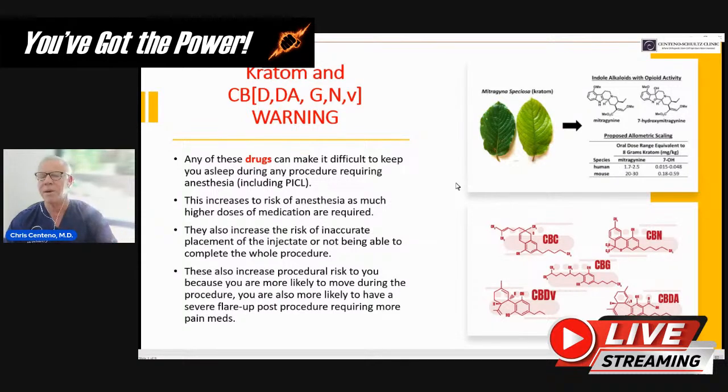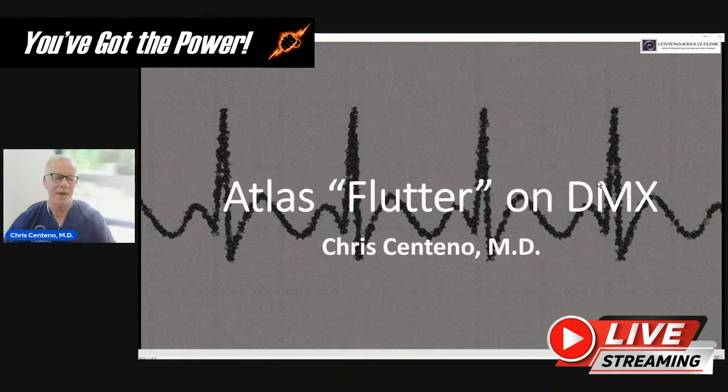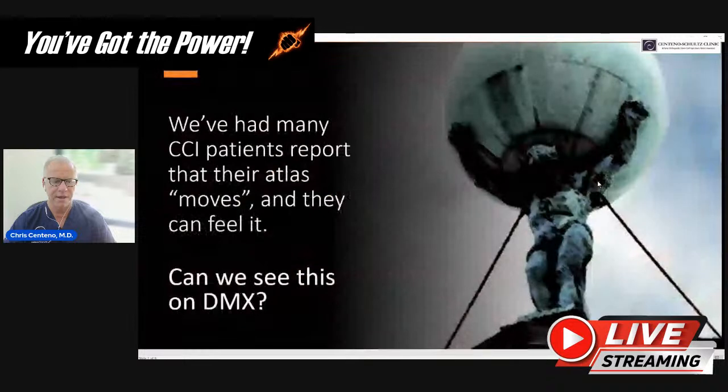I will bring this up a couple more times over the next few weeks to make sure that everyone understands what the issue is. So today, getting to the topic that we had planned, talking about Atlas flutter on DMX, or when the Atlas sort of jumps. And this has been something that my CCI patients have described to me for years. Sometimes it feels like their Atlas is shifting or literally jumping, or at least that's how it feels to them. And Dr. Katz and I have been catching more of these on digital motion X-ray. And he was actually the one that showed this to me initially. So we'll go over that case today.